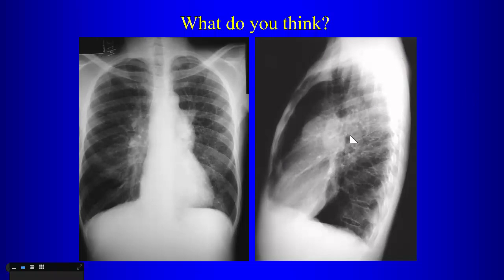Here on the lateral view, this round lucency, what is that? Left main bronchus. That's the left upper lobe bronchus or left main bronchus, depending on the patient's anatomy. Here's the left pulmonary artery going up and over the left upper lobe bronchus, so you can see that that's dilated. And then this is superimposition of the main and the right pulmonary artery, so that's also dilated there.